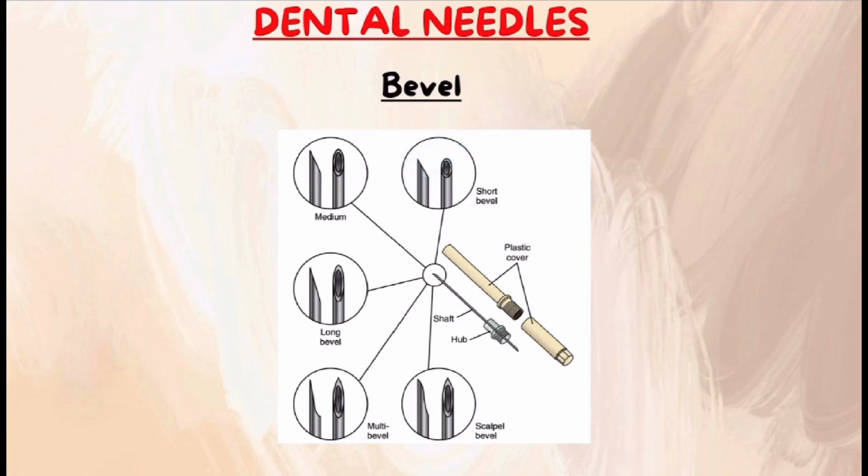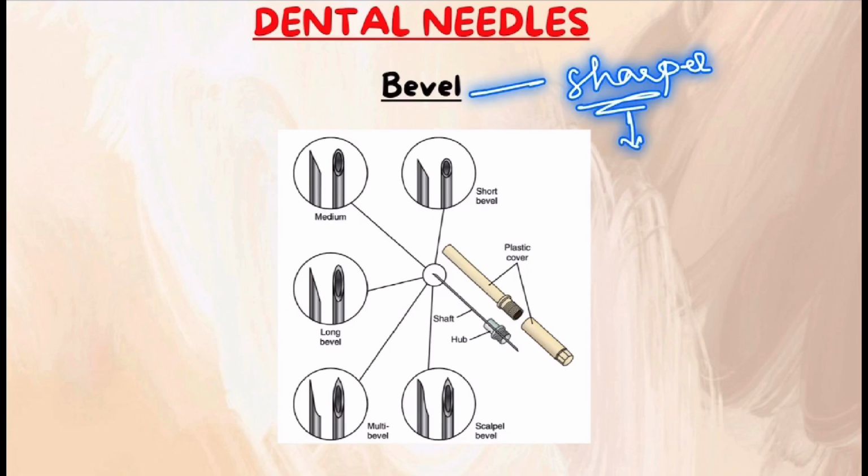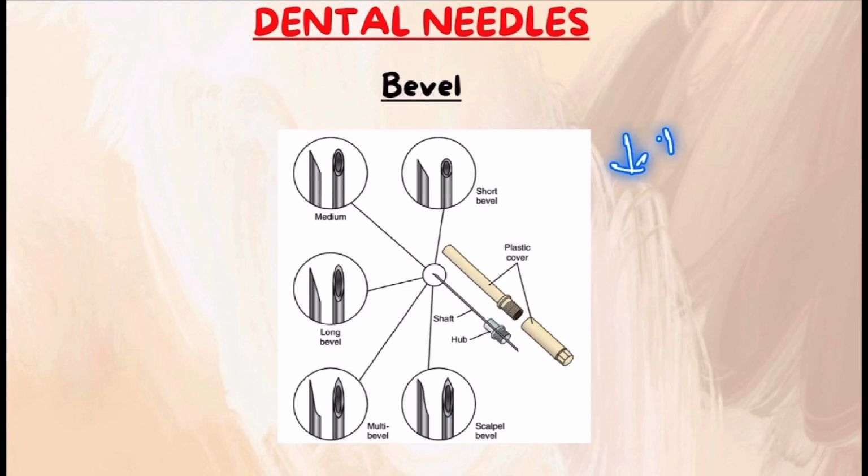And it allows the needle to smoothly pass through the mucosa. So this increases the patient's comfort. So the sharper the bevel, the easier the insertion of the needle into the mucosa, thereby reducing tissue trauma. For example, a multi-bevel needle offers the least trauma and greatest comfort.